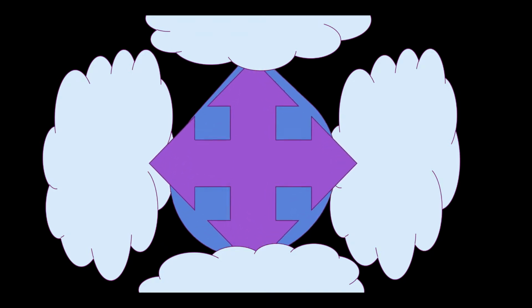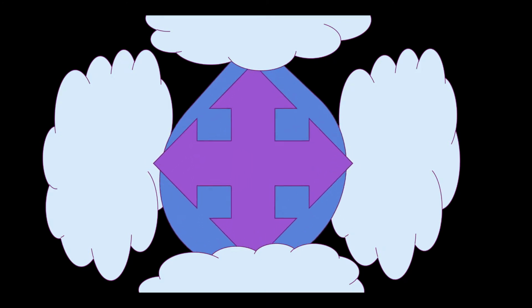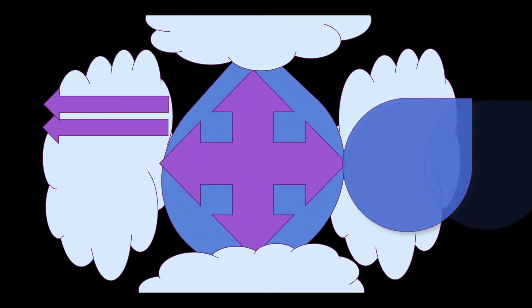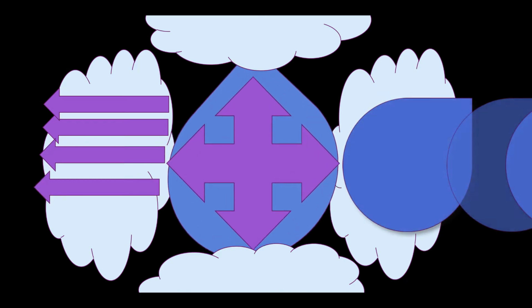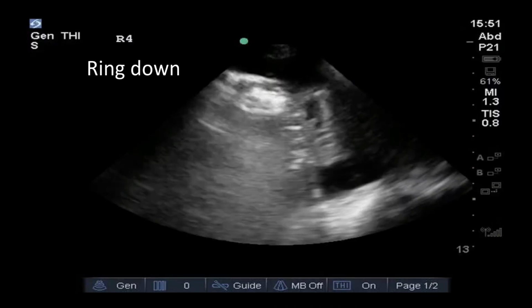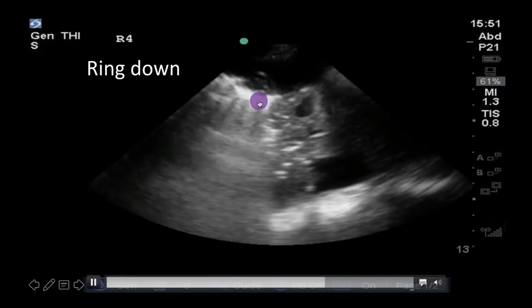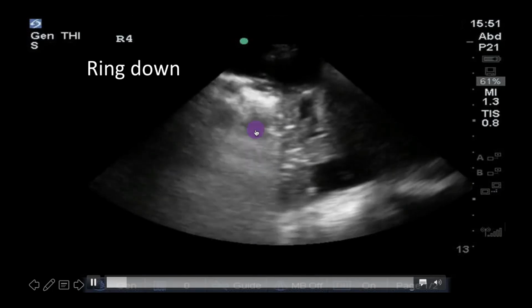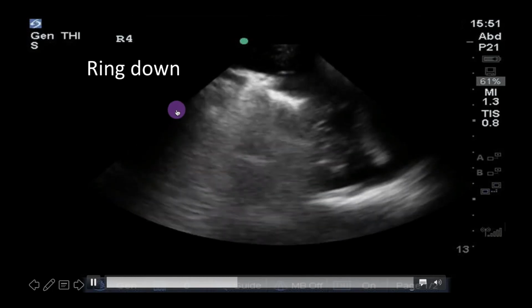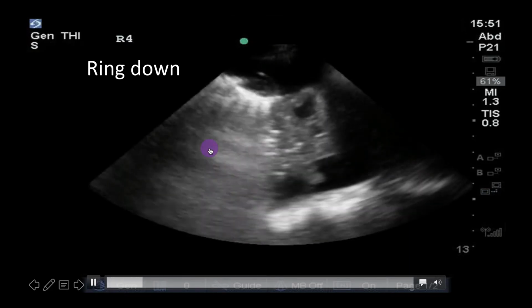This makes the fluid resonate or vibrate, and so the fluid continually sends ultrasounds back to the probe. This results in the image of a bright hyperechogenic line in the same plane as the beam. However, unlike B lines, they won't begin at the pleura, and also they won't be as well defined.